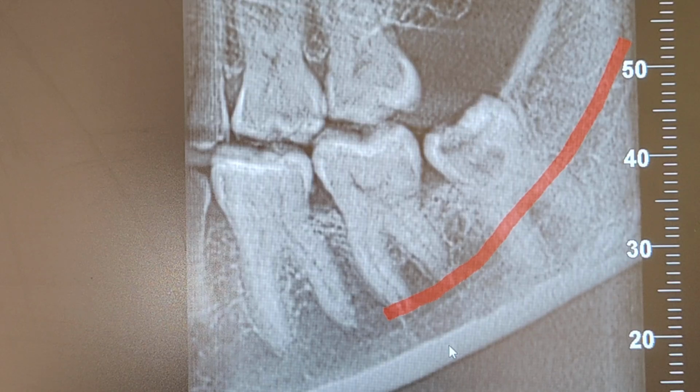And regarding the position of inferior alveolar canal, that's the buccolingual position. Inferior alveolar canal in the third molar region runs lingually and it slowly moves on to the buccal aspect, and in the mental foramen region it turns and opens buccally. And in the last 10 years, seeing many patients' cone beam CT findings, I have seen very minimal cases where the inferior alveolar canal runs buccally with respect to mandibular third molars.